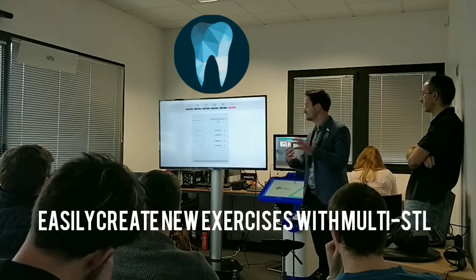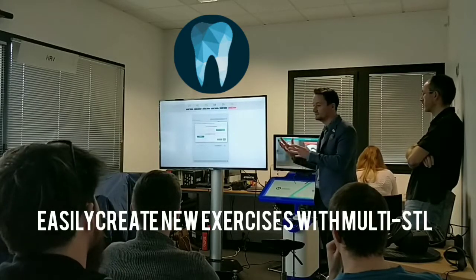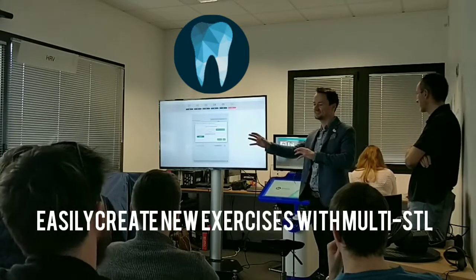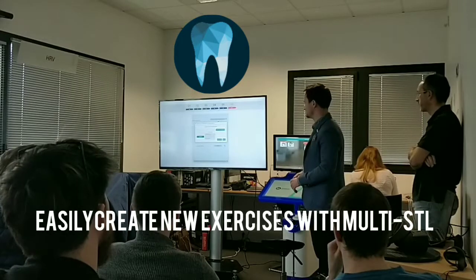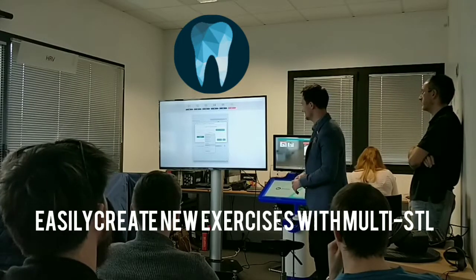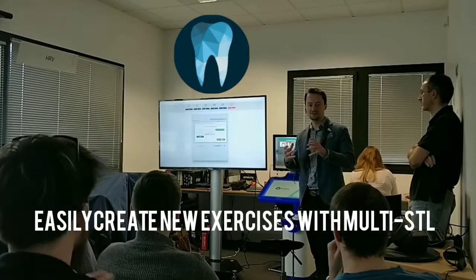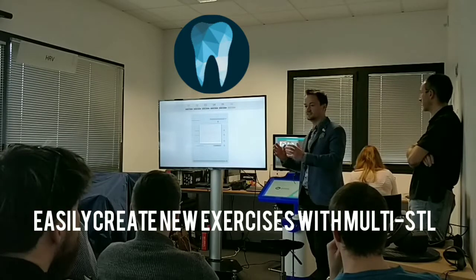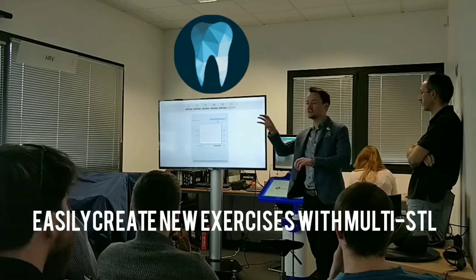And then it's super easy. We just go File, Export to Virteasy, we give it a name, we choose the category, and then we export it off to the server so it's available from all of the simulators in the simulation suite. And you see here at the bottom, we had an exercise for international. So we're starting to create a repository for all of the universities that use Virteasy, so that they'll be able to share exercises with the other universities.